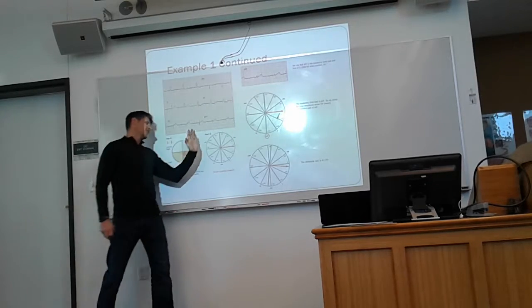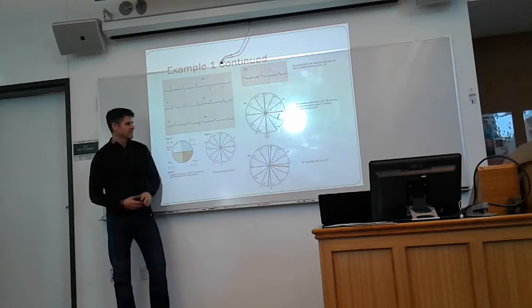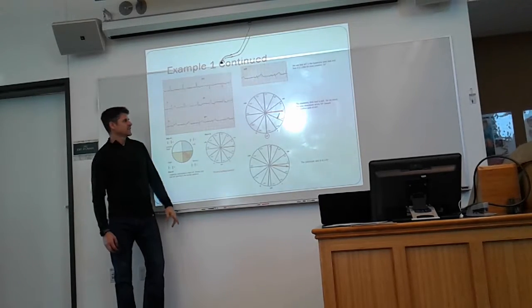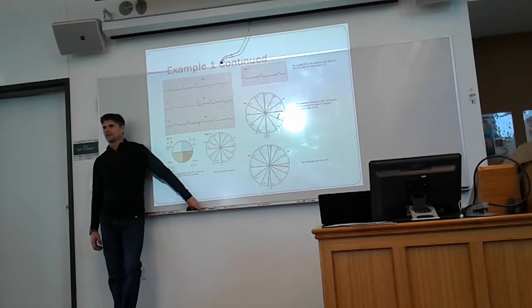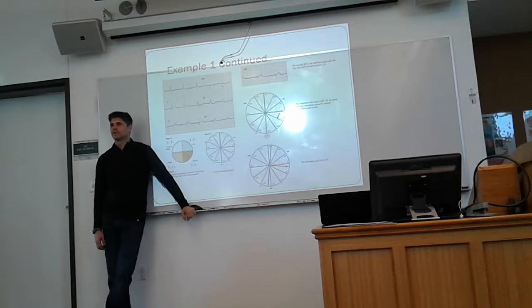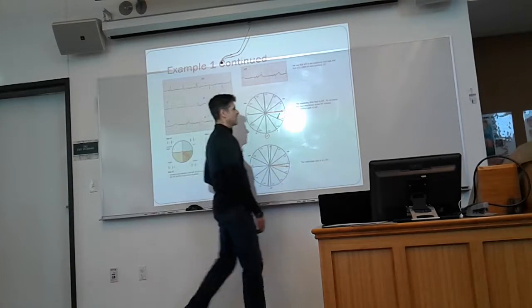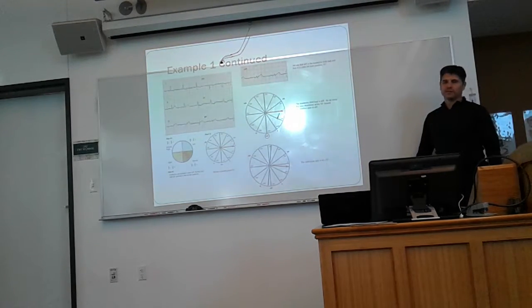So we've set our T on AVF because it's the most biphasic. It's pointing towards lead 1 already. And now we have to decide how to shift it. We know that it's slightly more positive than negative, but just barely. So we're going to shift it 5 degrees or so, and we'll be within 5 degrees of the actual axis. And we're going to shift that 5 degrees closer towards the positive, towards AVF, because it's positive, as opposed to away from AVF. Make sense? And that gave us our degree, within a margin that is perfectly reasonable.